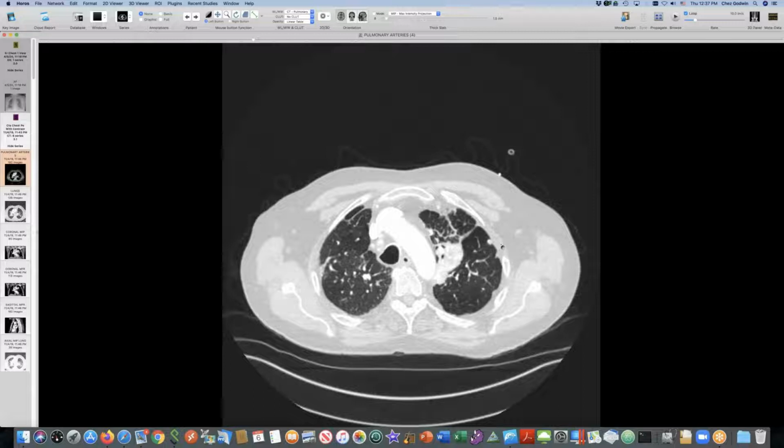So Martine wrote a very good article back in 1990, and she said that the fact that we see this same phenomenon, not the high attenuation, but these subpleural deposits with sarcoid, implies that sarcoid is something that's inhaled, the way silica is inhaled. It gets into lymphatics, and it's the lymphatics that carry it out to that subpleural location. I think that's very, very good reasoning.